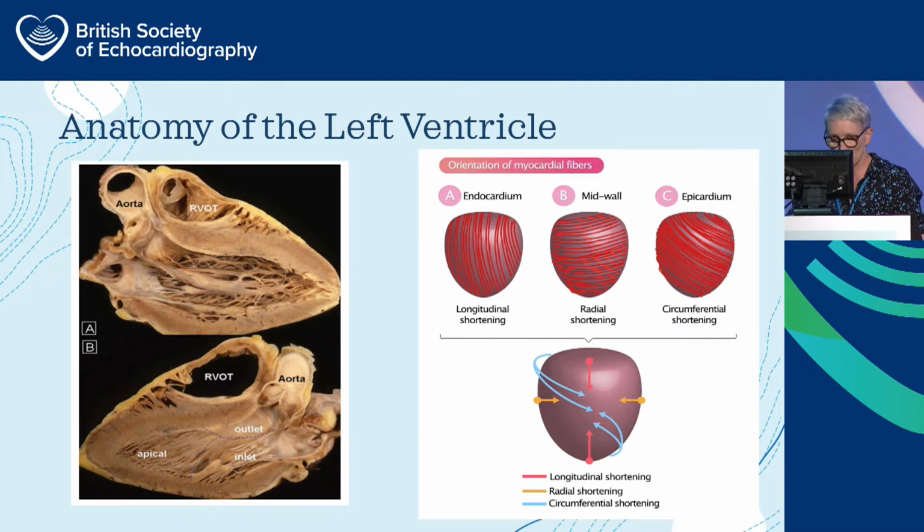The apical portion includes fine trabeculations, but you may also see some false tendons and muscle bundles down there as well. There's usually two papillary muscles, the anterolateral and the posteromedial, and these attach to the chordae, which obviously then insert into the mitral valve leaflets.